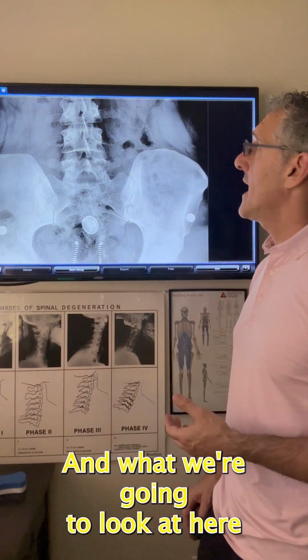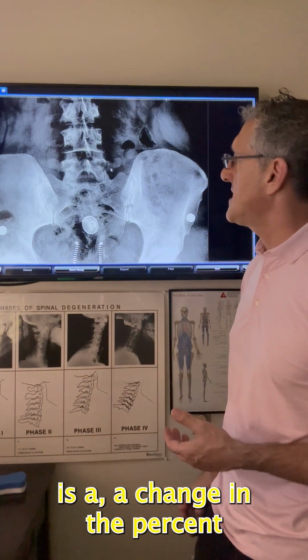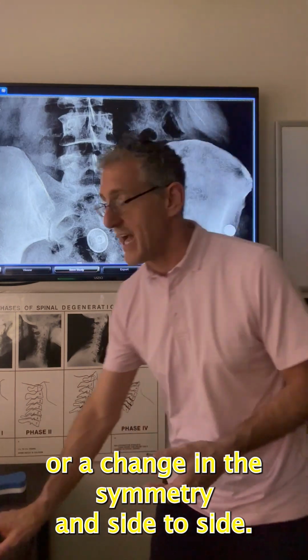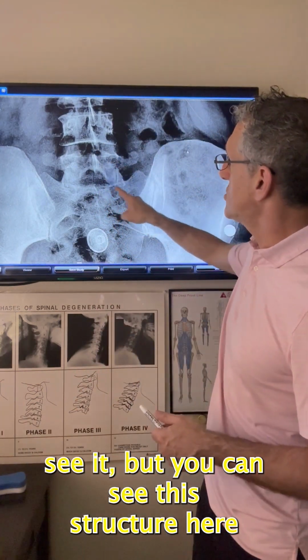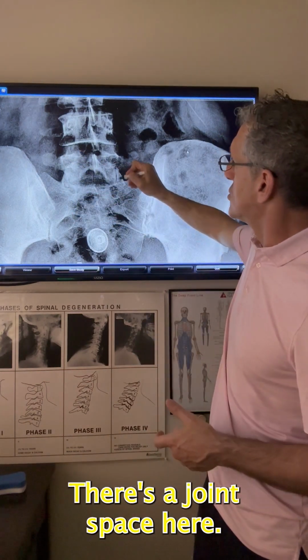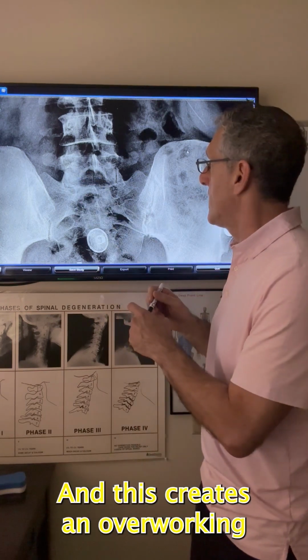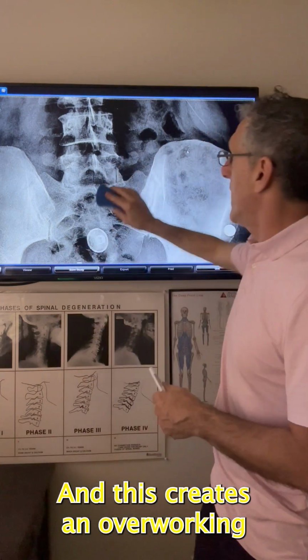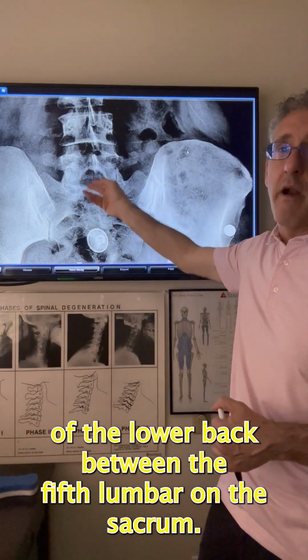And what we're going to look at here is a change in the facets, or a change in the symmetry side to side. Now on this film, you might be able to see, I don't know how well you can see it, but you can see this structure here looks different. There's a degree of asymmetry here. There's a joint space here that I can see. I can't see it here on this left side. And this creates an overworking or a burdening of the lower back between the fifth lumbar and the sacrum.